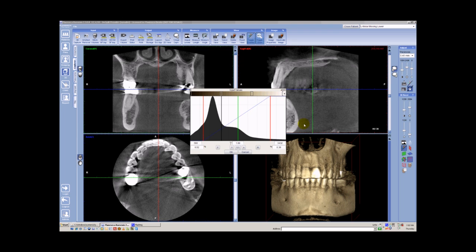As well as being able to adjust what we're seeing as far as density of material, we also have a color band at the top, and there's a drop-down menu for this color band. This is the default tone of color applied to the 3D volume. However, we can apply any kind of preset color band that we have here. So if we wanted to make a real psychedelic rainbow color, we can. The purpose of this tool, obviously, is just to give a different perspective to what you're looking at anatomically. So by changing the colors, by changing textures, by changing the reflections of the material, something may stand out that the human eye normally probably may not have picked up otherwise.